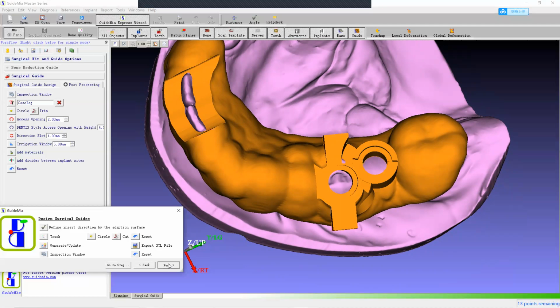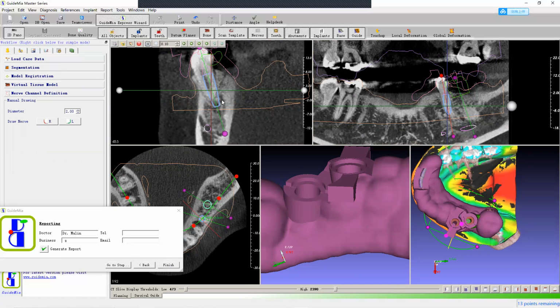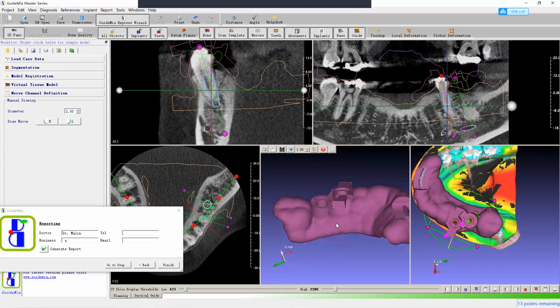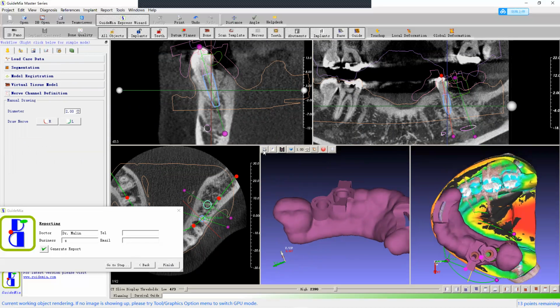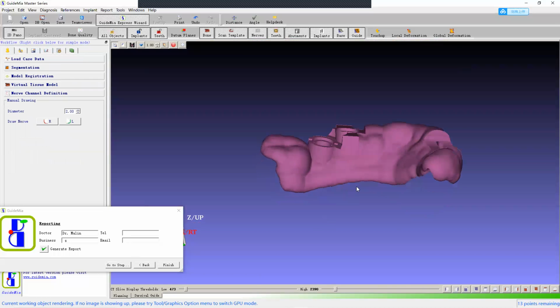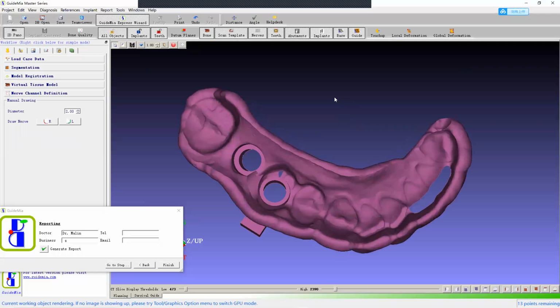So before we generate the report, going back to Dr. Berger's question, is your system going to tell you if the timing is correct? I mean, if the insertion path is correct? So here's what we have. Let me maximize this window. I'll rotate this. So take a look at the back of the surgery.